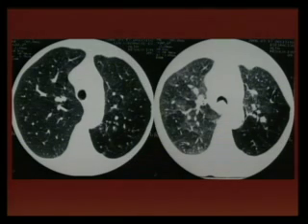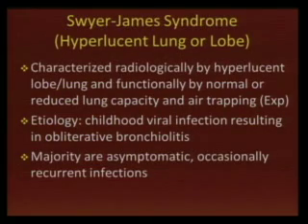You can see a pretty normal lung with some areas suspicious for air trapping disease, but on the expiratory film there is a large zone in the left upper lobe and left lower lobe that is secondary to the BO. In this patient it was a post-infectious BO.